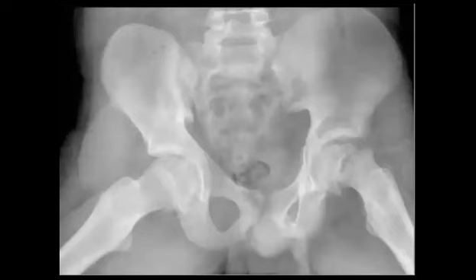You remember when we talk about the pelvis again and again, if it is not septic arthritis and it is not Legg-Perthes, then search for this appearance. So here is very typical for slipped capital femoral epiphysis. Sometimes it's bilateral. Then you should try to draw this line, and you should find that part of the upper femoral epiphysis is cutting this line.